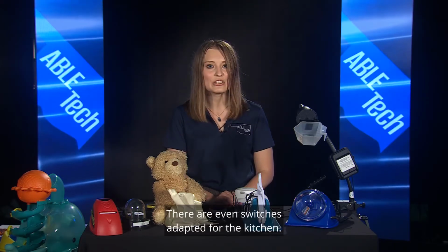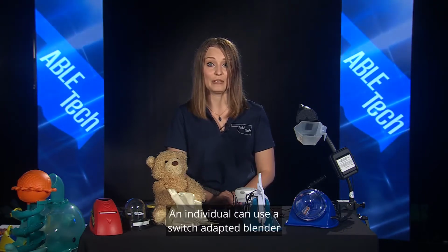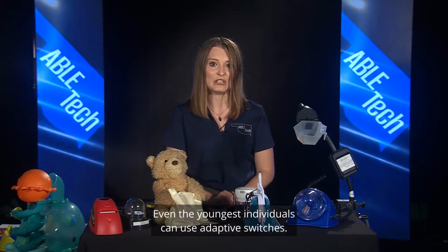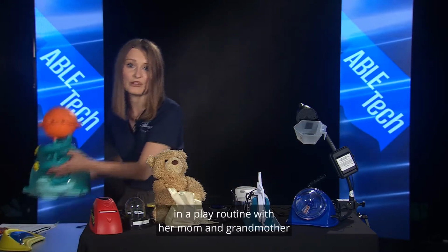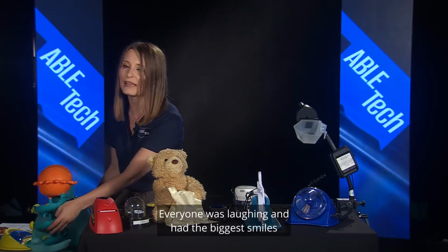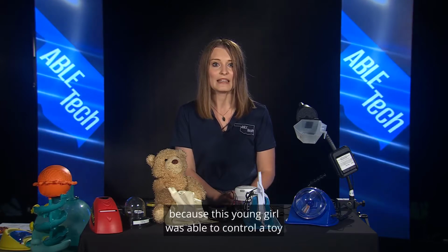There are even switches adapted for the kitchen. An individual can use a switch adaptive blender to make his or her favorite shake. Even the youngest individuals can use adaptive switches. We recently saw a young girl participate in a play routine with her mom and grandmother using this adaptive ball popper and switch. Everyone was laughing and had the biggest smiles because this young girl was able to control a toy that she previously could not.